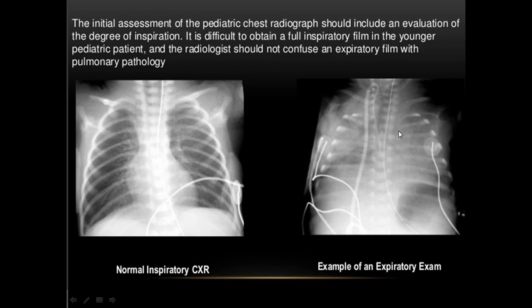Again, when we repeat this child and take a fully inspired view, all these findings have completely vanished. So this is the normal X-ray. I do assume that it's very difficult to take a proper inspiratory film in children because of their non-cooperative nature.